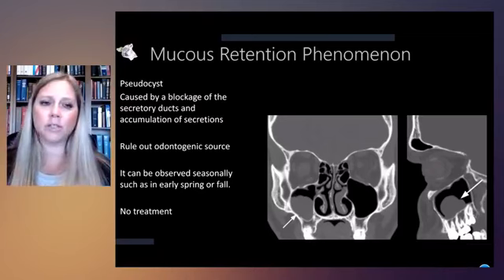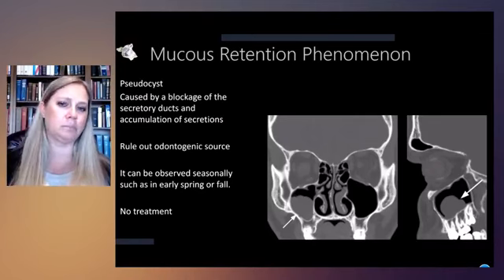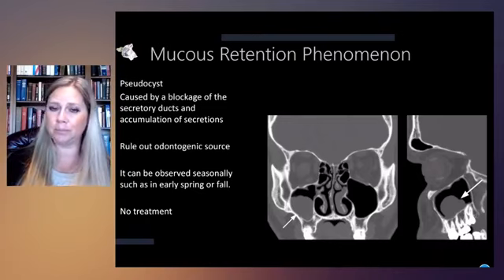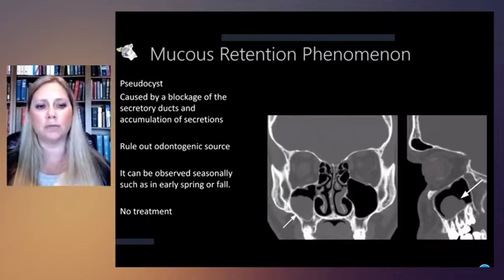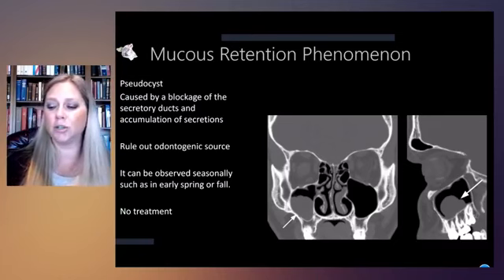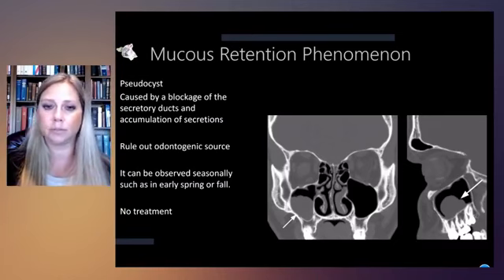We can also have mucus retention phenomenon as well. This is basically just the lining of the sinus kind of blows up like a balloon. We see it more common in fall and spring with seasonal allergies. Really don't have to do anything about this, again, unless you're going to do a sinus lift and bone graft.